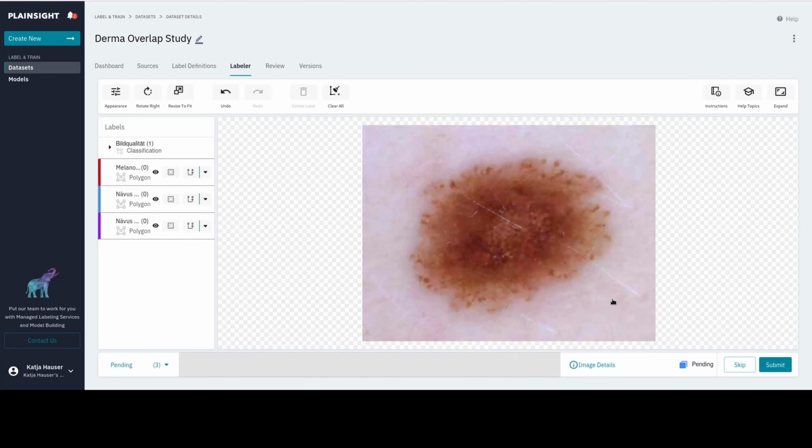In this image, we see a light brown lesion that contains globules in the periphery, is structureless moving inwards, and that again contains more globules in the center. That means in this case, we're dealing with a symmetrical combination of patterns and colors, and therefore quite certainly a nevus. We've prepared for you two classes for the nevi, namely nevus leave-in and nevus excise. In this case, I would not excise this nevus.